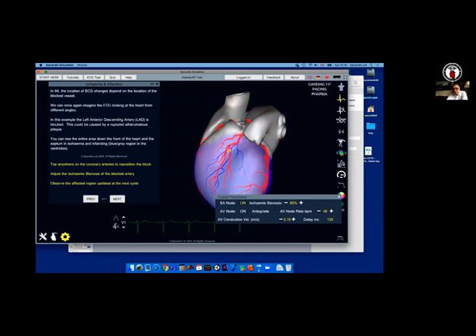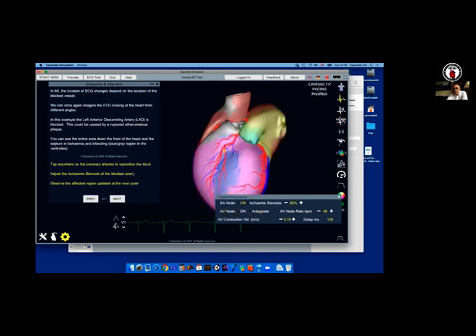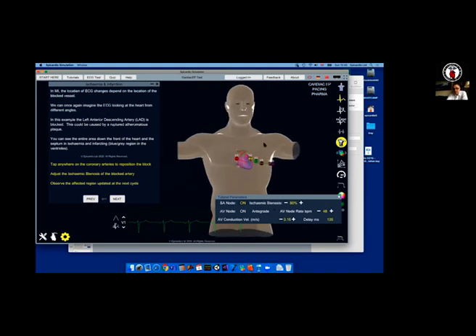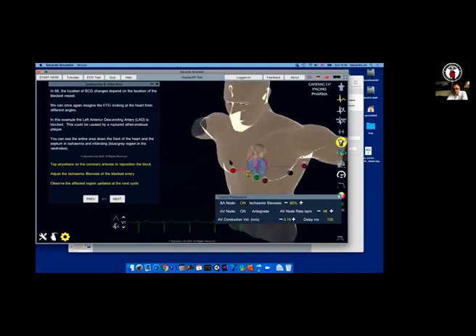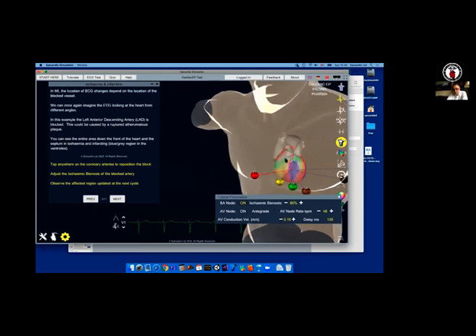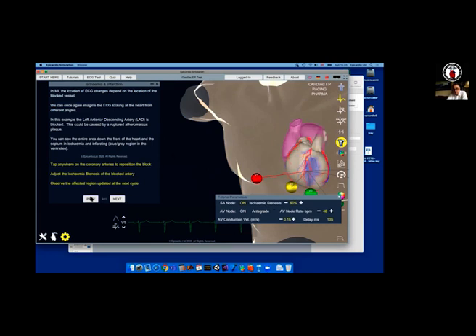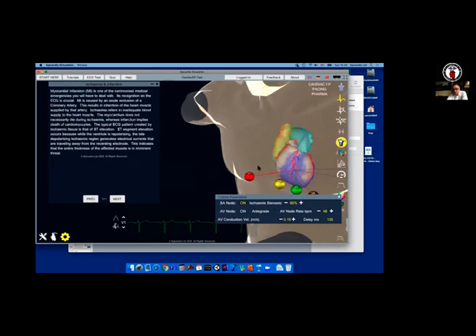At the same time, we can look at patient examples of similar situations. We see the ST elevation, how it appears on patient ECG, on the V1 to V5 and V4 leads. And another really interesting thing we can do is bring up the torso with the leads. And this will help us really see why there is the ST elevation in which leads. Now let's see, I'll have to go back into making sure my occlusion is at the right place as it was before.